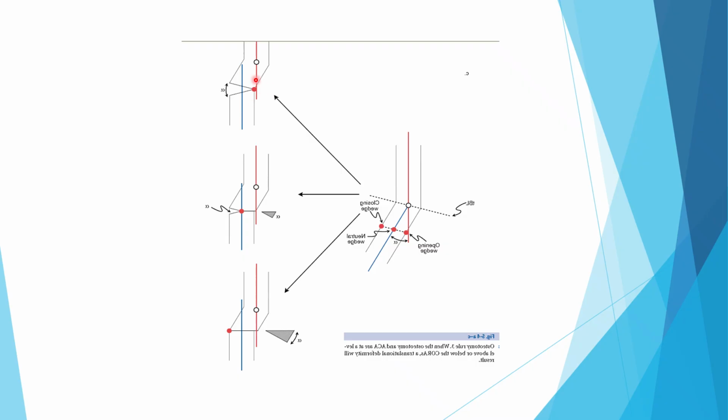So in the first one, we used the points on the convex part of the deformity, and I told you what happened. We ended into a segment that is in line with the other segment, but there is a translation and there was some increase in the length. Now we use this scenario. We put the proximal reference point and the distal reference point in that spot, which is in the concave part of the deformity. So the deformity is like this. We put it in the concave.